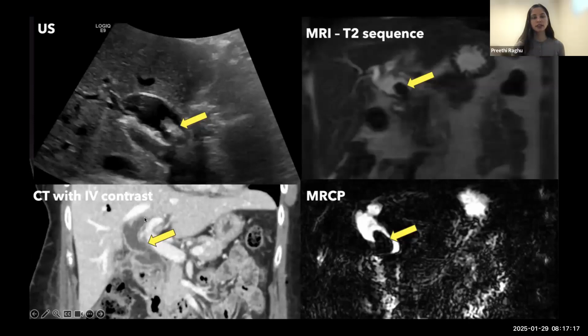Interestingly, note that that same person had a CT quite recent to that, and we don't see this large stone. And that's the pitfall with CTs. It's just lesser sensitivity for gallstones. So for things like choledocholithiasis and cholelithiasis, much better to actually start with ultrasound for that reason.